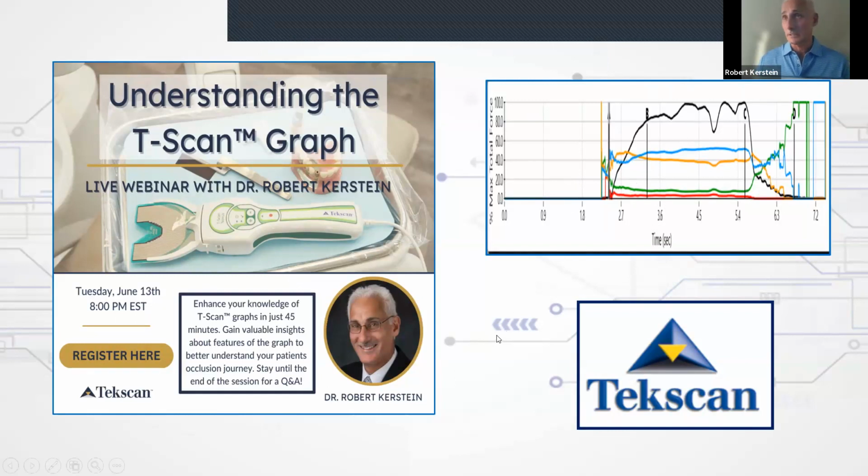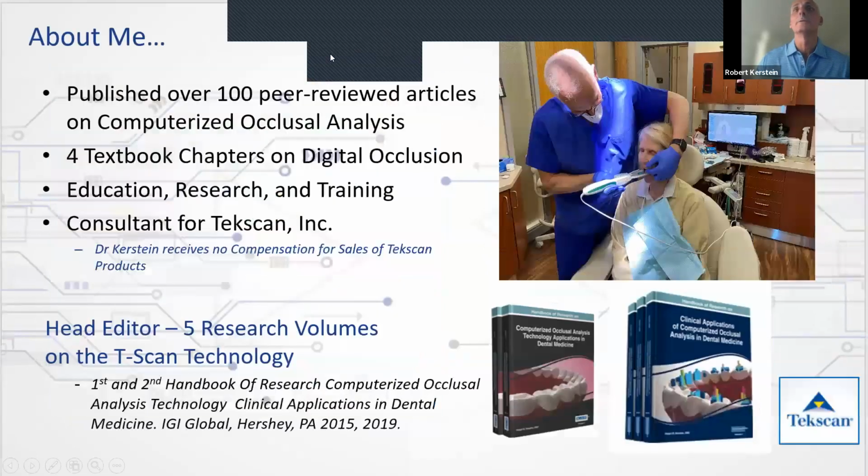And actually, it's a skill that helps you become a better and better TScan user. So hopefully by the end of this session, you'll all have a good handle on what all these colored lines mean and what they're actually telling you. And the goal is actually to be able to read the graph without playing the TScan data. So if we've succeeded in educating you, you'll have a better handle on all of that when we're done.